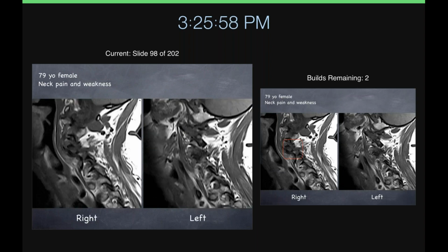Yeah. Well, the edema is just the abnormal stress pattern. And here it's a little hard to see at this level, but these facets, they're degenerated, but they're still normally aligned. Here, this is abnormal, and it's jumped right here.